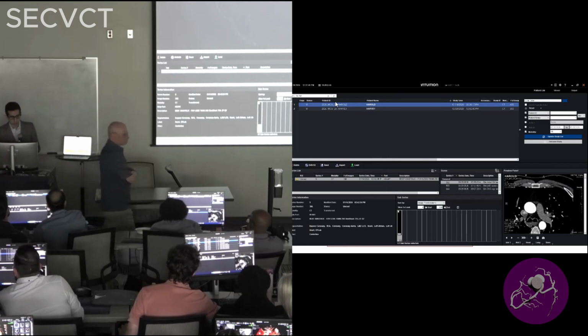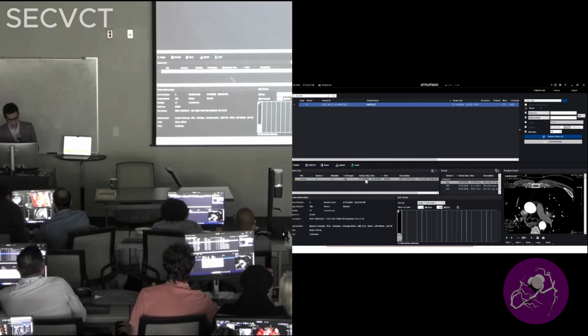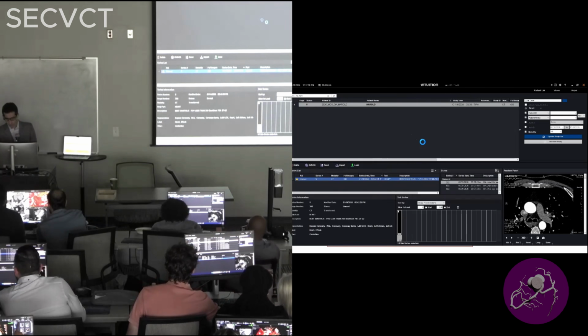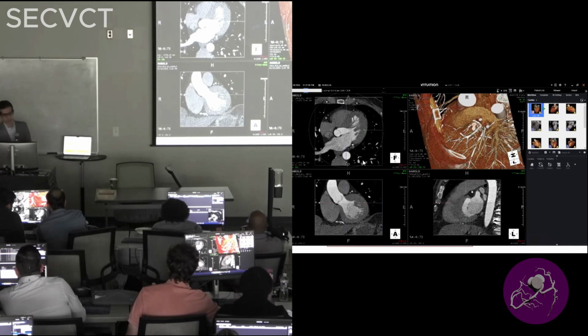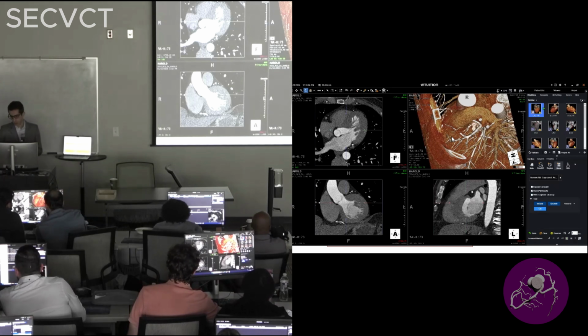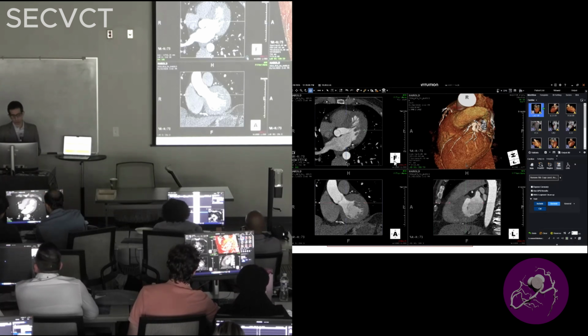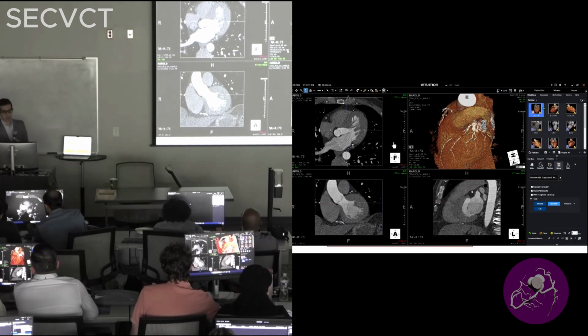So patient Harold, and then go ahead and load it as a cardiac. We're gonna give it maybe a minute or two. Again, I'm just gonna be reading out loud with you folks, and you do your thing on the station. So first thing, this was a one phase 73%.